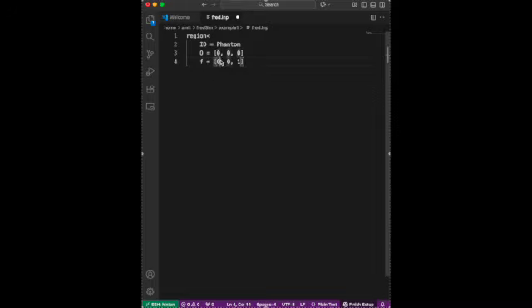But what if I write it like this? How will my beam go? In that case, it will go diagonally in 3D, if you have a cube, from the leftmost corner on the front to the uppermost corner at the top of the cube, diagonally. I hope I'm making sense. Anyway, let's keep it simple.